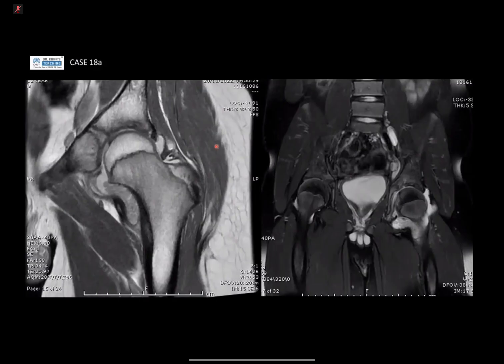An acute flare of JIA, juvenile idiopathic inflammatory arthritis, people can still go on. They can still carry on. They are not in excruciating pain. So it can be grumbling for quite a while, and then it's incidentally picked up. So it's this synovial proliferation that's quite marked, and the absence of marrow edema.